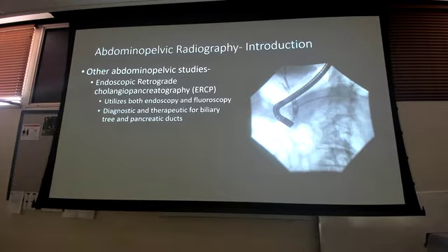So ERCP is specifically for the biliary tree, right? The nice part about this is it uses endoscopy, and that's a fluoroscopy picture. We talked about that C-arm before in surgery, how it can be used for procedures to see where we're going. That's what this is. It's a spot film from that. They did some scans and they feel like there was a stone sitting in the biliary tree, so they're going in there to try to get it, right?